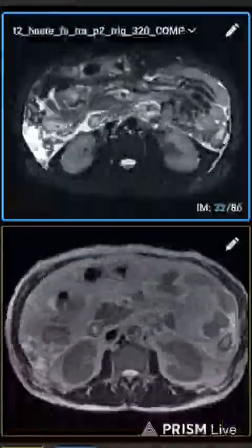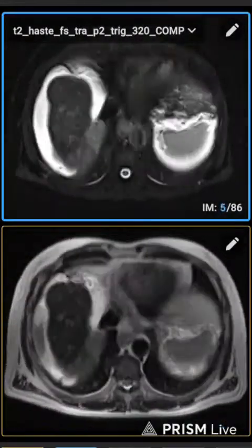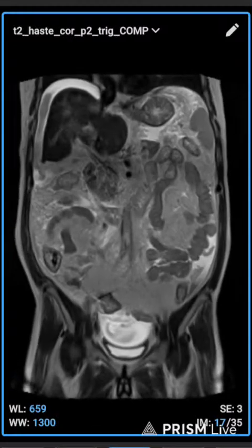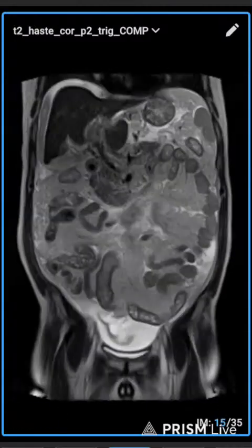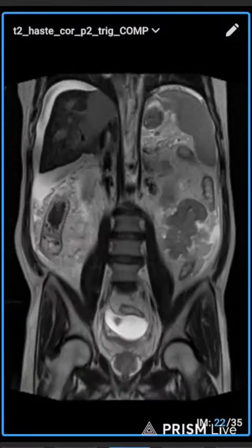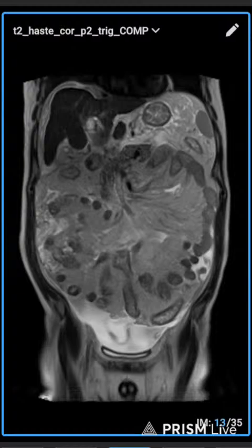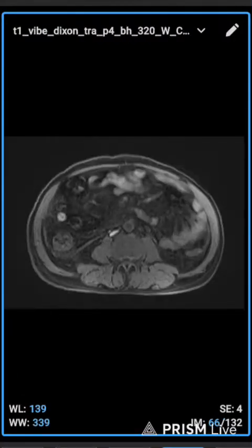So we find out the collection in this abdomen, ascites, was properly visible in T2FS. After that, the next scan is T2 coronal. In T2 coronal we find out the actual size. We will find out the lesion was large in this area. So in coronal we visualize the lesion, and we try to find out the CBD, but it's difficult just because there is lots of ascites.